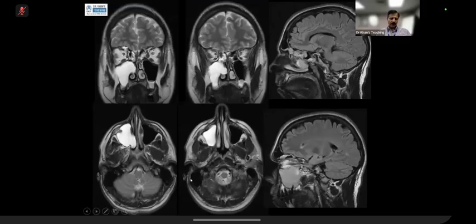Okay, now candidate 1. Let me describe this for you. This is an MRI, and this MRI was a brain MRI. The finding is in the paranasal sinuses, but this is a classical brain MR: a FLAIR sequence, coronal T2, axial T2 and axial T2.